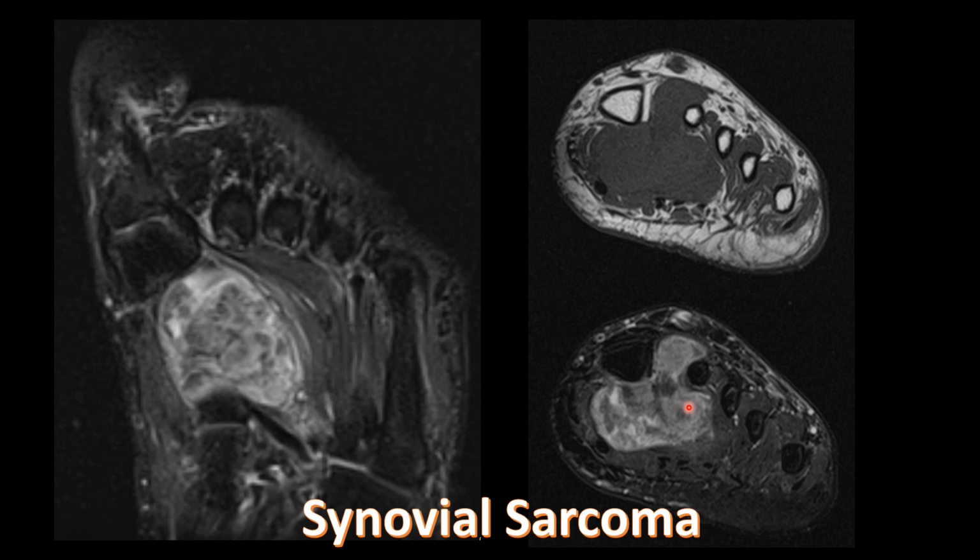So any enhancing mass within the soft tissues of the hand or foot or around the ankle that has calcification and no intralesional fat, you should think about a synovial sarcoma. Ultimately, the diagnosis has to be confirmed with a biopsy.